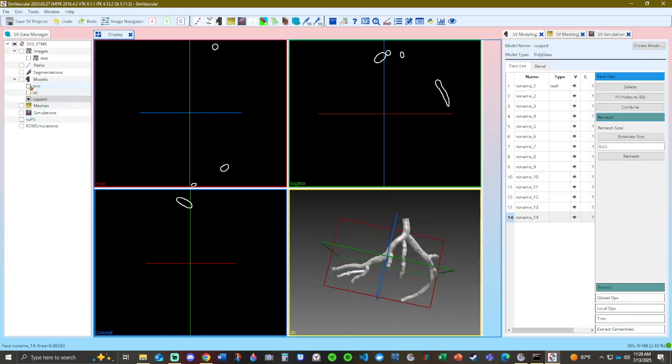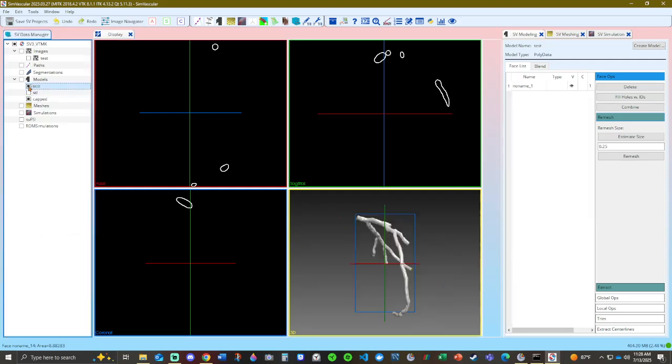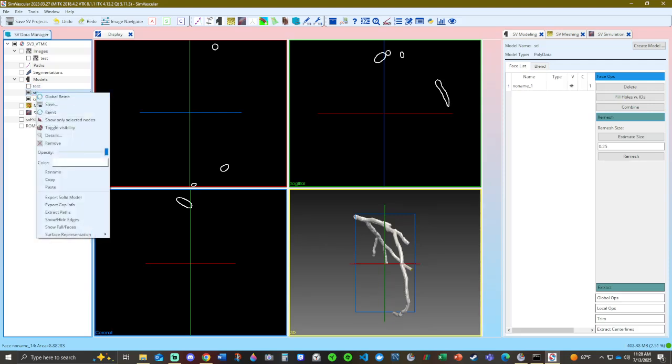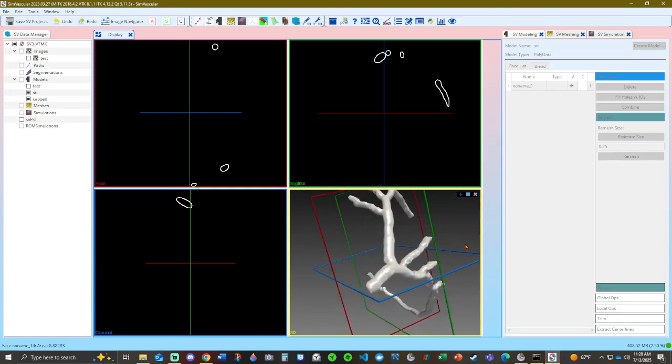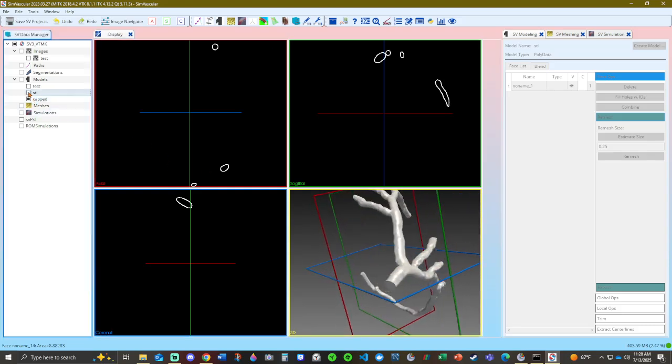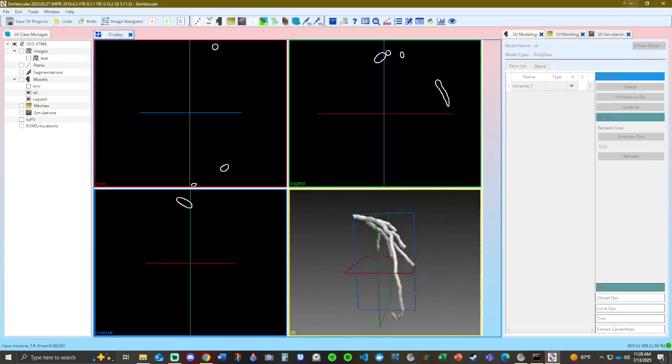and then when you compare it to just the STL output, it should just be right on top of it with no misalignment or anything. So let's get into it.